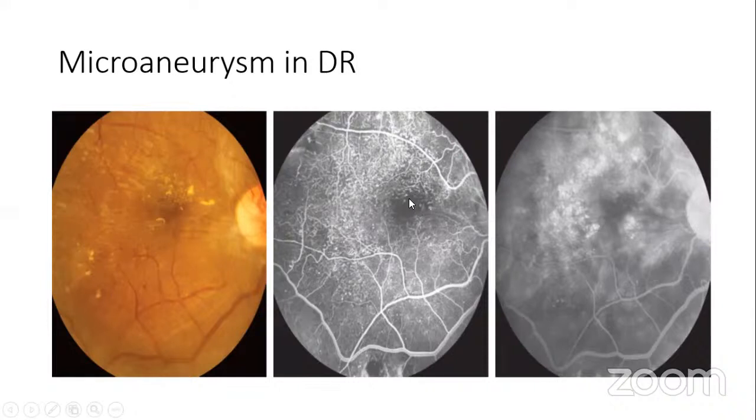This is a microaneurysm. It's the dilatation of the vessel around those regions. This is another one. Then the telangiectatic vessels are around here, but most of them are microaneurysms. The dots are the hyperfluorescence; the vessels have dilated in those regions. All right. Okay.